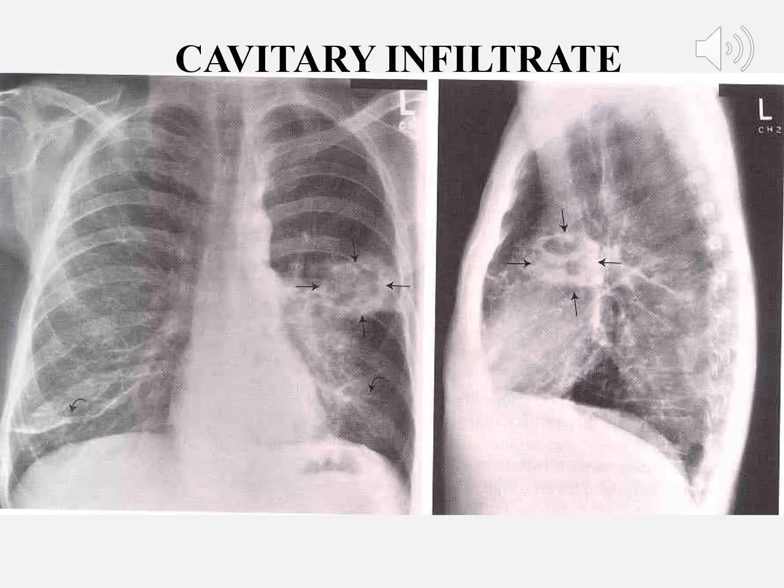This is a cavitary infiltrate or cavitary lesion. Look at the left middle lung field. You can see that there's a cavity there, and then think of it as that. There's a cavity containing something. Generally has a thick wall, sometimes contains metastases, but can have other things in there. But that is a cavity appearing infiltrate.